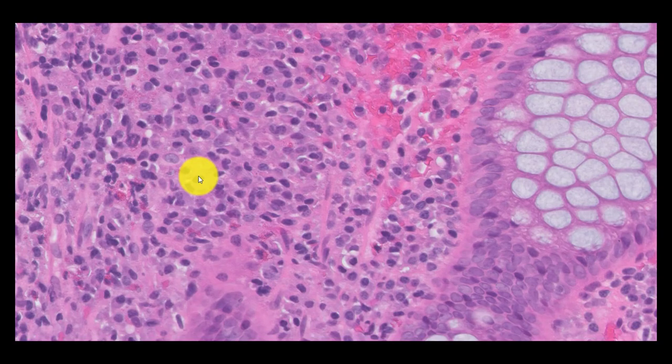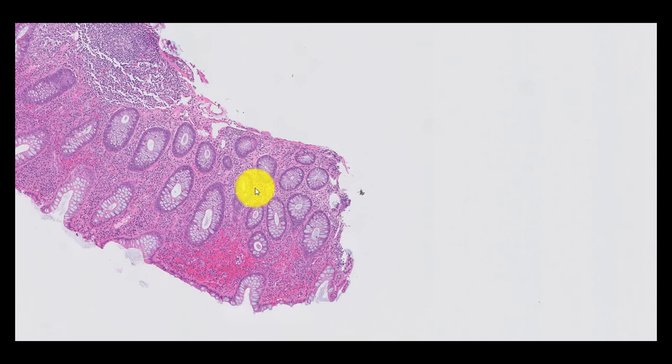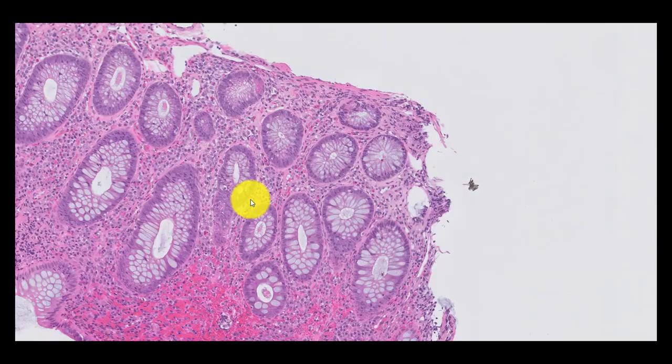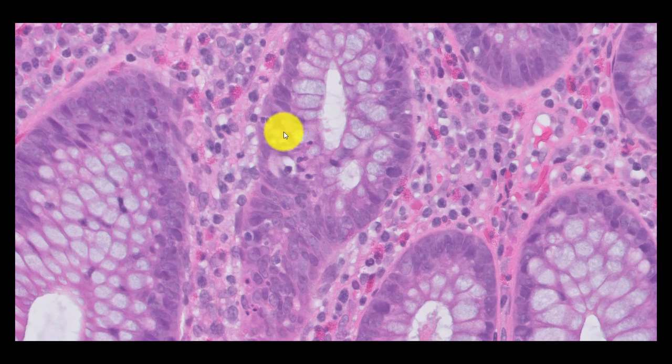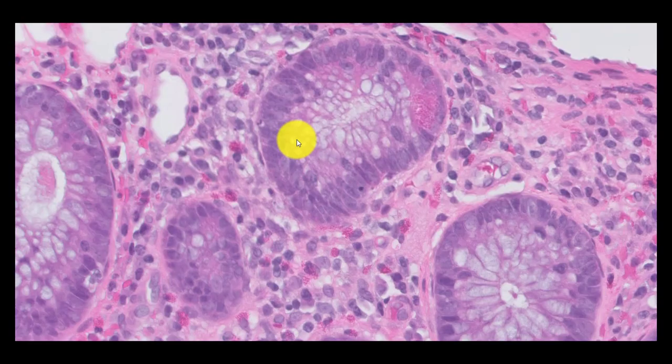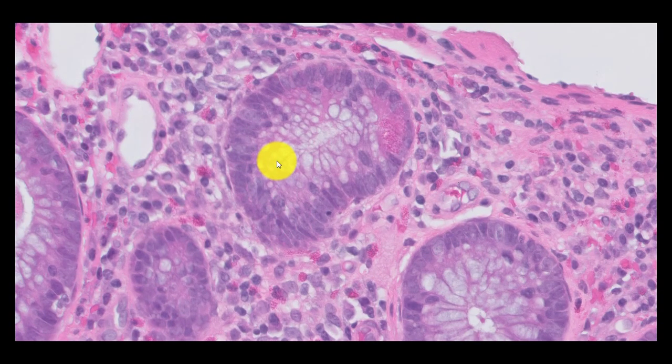Additionally, in the mucosa, you see tons, in fact, sheets of plasma cells. While there was a lot of chronic inflammation, actually, there's very little in terms of activity. I did manage to find focal cryptitis, but no cryptabscesses to be seen. And finally, there is Paneth cell metaplasia, which, as you know, on the left side is considered a metaplastic phenomenon.